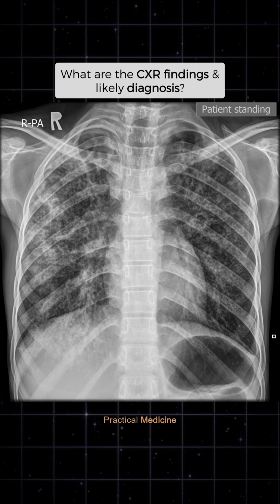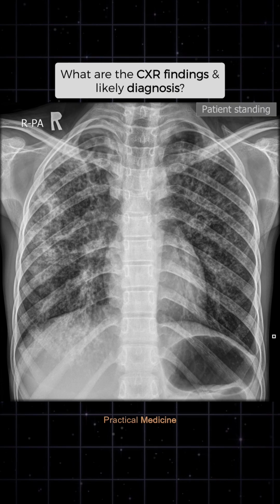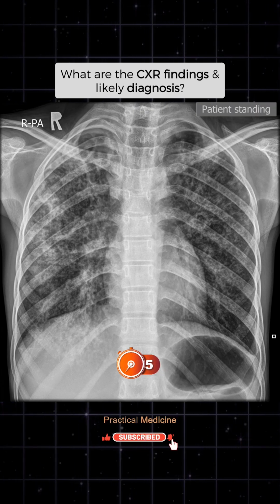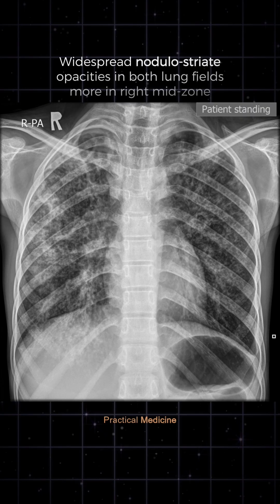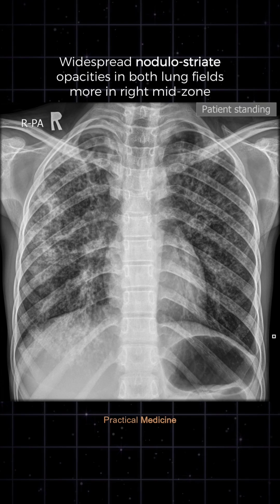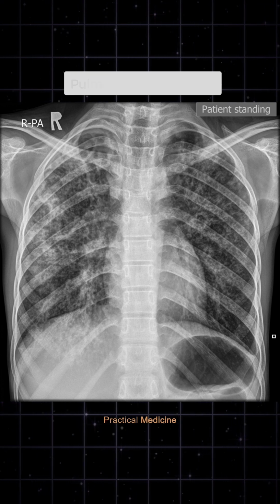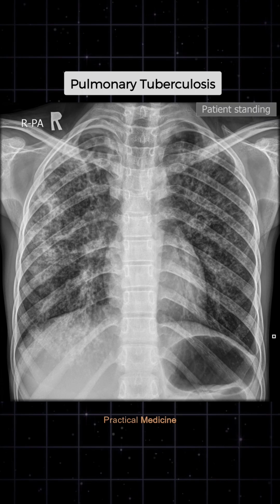What are the findings in this chest X-ray of a patient with fever, productive cough, and weight loss? What is the possible diagnosis? There are widespread nodulostriate opacities in both lung fields. Looking closely at the radiograph, there is also a cavity in the periphery of the right middle zone. The findings in the context of clinical history suggest the likely diagnosis of pulmonary tuberculosis in this patient.